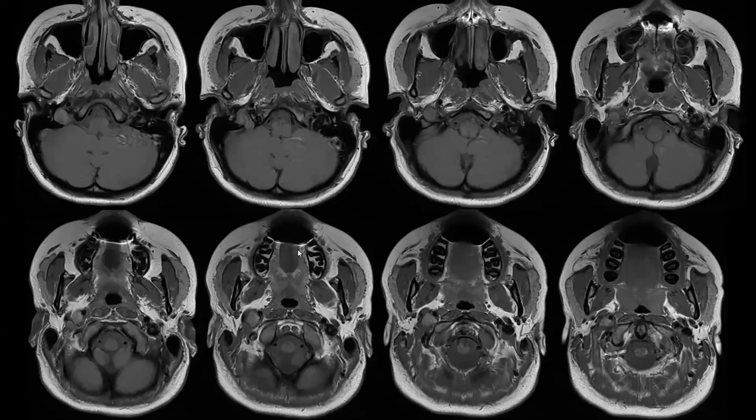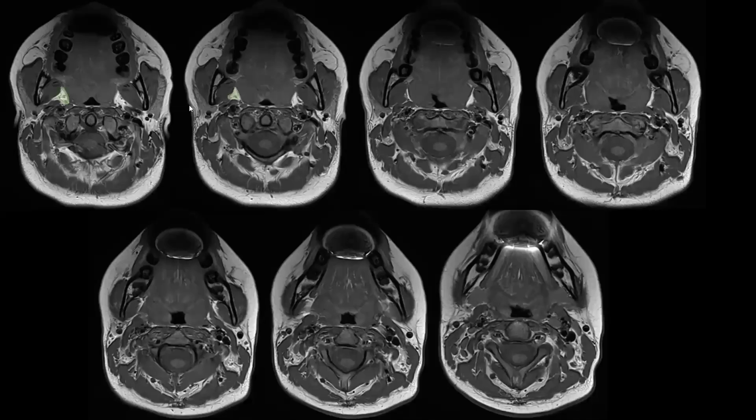As said, the parapharyngeal space extends quite deeply into the suprahyoid neck. So if you look at these consecutive axial T1 weighted images, let's focus on the right parapharyngeal space and let's follow it all the way down. And we can see that it becomes a bit larger, but it's still present over here, still over here. And let's even look deeper. So here we are again. Let's look on the right side and it becomes smaller, but it's still present.